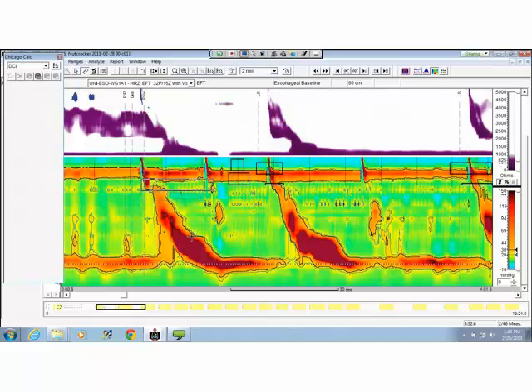Now there's another little dry swallow in the way, but if that little dry swallow weren't there, I would come all the way down to here. I don't want to go way out here, especially if there's a lot of cardiac artifact. That can throw things off a little. And I don't want to cut off any part of this peristaltic contraction. I want to go until the peristaltic contraction is completed at the proximal edge of the LES and let go. And the normal range, remember, was 450 to 5,000. 5,000 to 8,000 defines nutcracker, and anything above 8,000 defines a jackhammer esophagus.